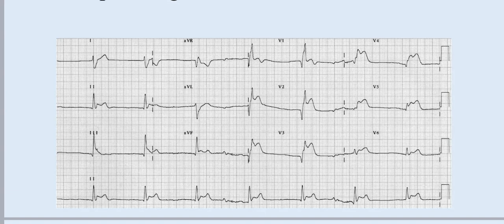So this is Takotsubo. The thing that can tell you from the ECG that this is probably Takotsubo is that you can see changes in the ECG and troponin, okay? And then when you use echo, you are confronted by a discrepancy: the ECG changes are disproportionate to the amount of damage you demonstrate in echo.